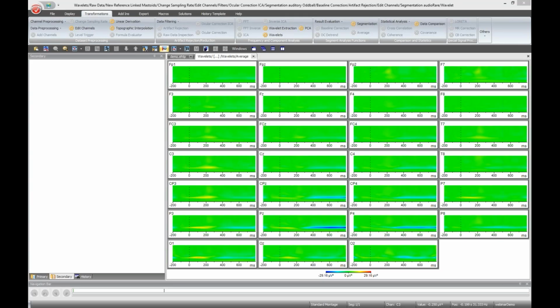If this analyze refers to the statistics, well, for wavelet specific, you would first need to define what exactly you want to export. A specific time range? Do you want to average across a time range? Do you want to average across frequencies?